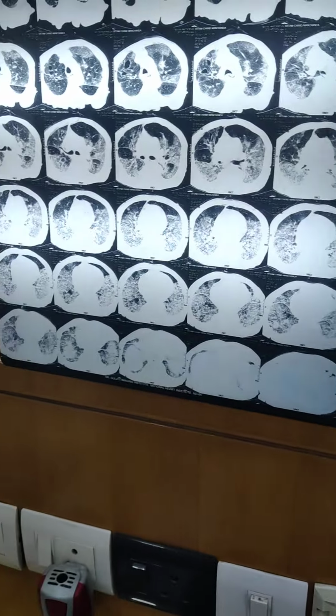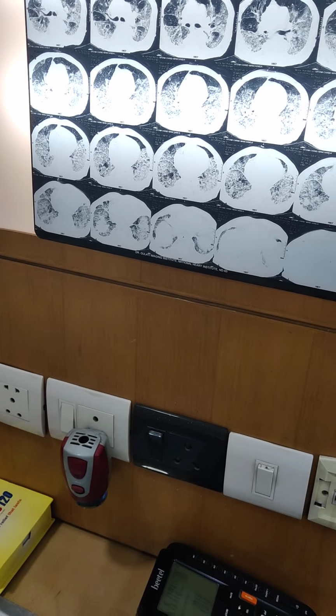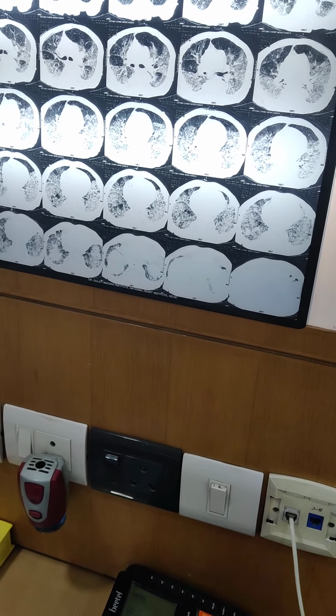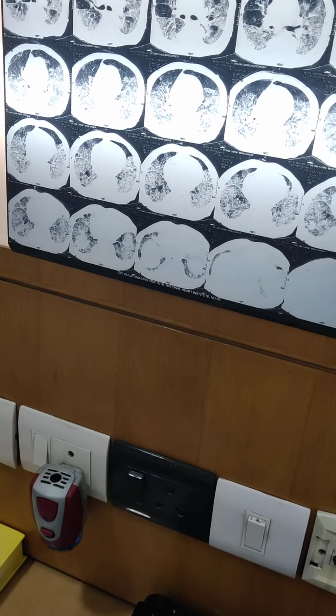So this is the hallmark of COVID. And whenever you have a patient coming with a fever and RT-PCR issue, this is the first thing. And you see most of the lungs are involved, all the lobes, more than 80% are involved. And how we classify severity, we map in all the lobes and accordingly. This is number one.